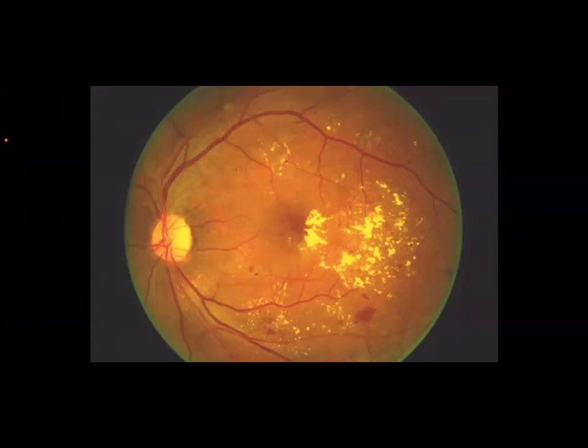If you can see the blood vessels, they will go like a curve. Okay, the center of this curve usually has hyperpigmentation, which is the macula, as we have just mentioned. Okay, this area is the lateral side. The medial side is behind the optic disc. Is this clear? So this hyperpigmented area is lateral to the optic disc. It's called the macula. The center of it is the fovea. If there is any lesion here, regardless of what the lesion is, this is maculopathy, diabetic maculopathy, and definitely the patient will have a problem with his vision because it is the most important area for vision.